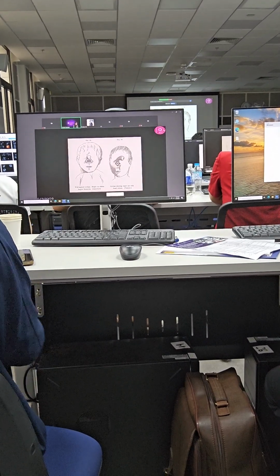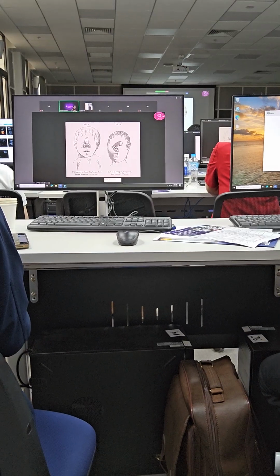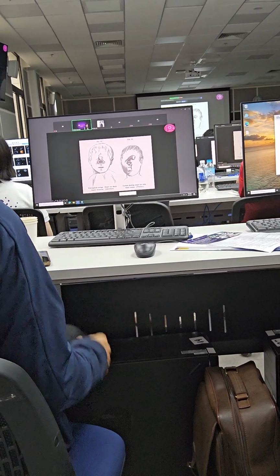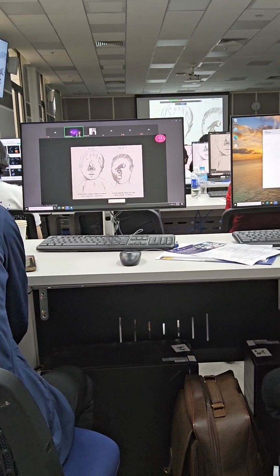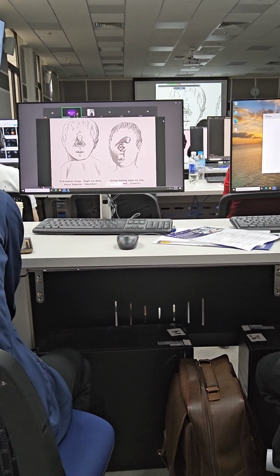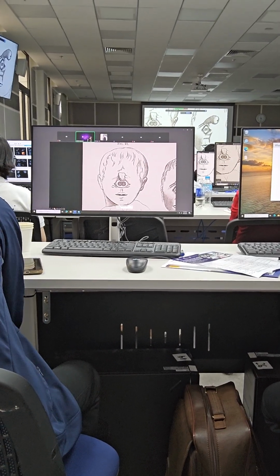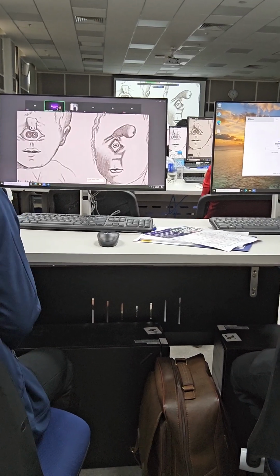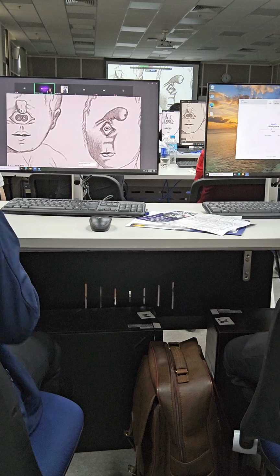But regarding the eyes, if you think that this is cyclops, it means one eye. However, inside of the eye, sometimes like this, right? You can see that there are two eyes inside of the one opening. And if you look at this, this is fused by two eyes, but the opening is one.